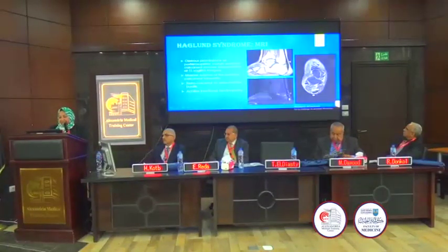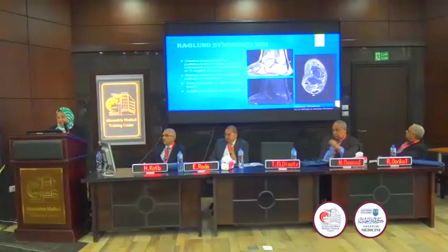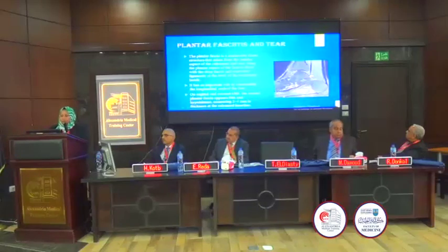And the insertional Achilles tendinitis, which is identified by thickening of the distal part of the Achilles tendon, which is also nicely demonstrated on axial images by loss of the normal anterior concave surface of the Achilles tendon, and the retrocalcaneal bursitis, and associated subcortical marrow edema related to the calcaneal insertion of the Achilles tendon.